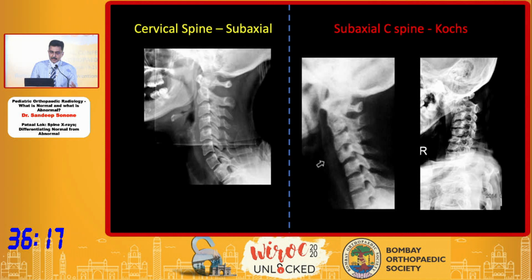This is a classical example of how we can pick up if we have normal anatomical landmarks in our head. The X-ray in the middle shows that there is loss of disc space between C3 and C4, indicative of intradiscal destructive pathology, which may possibly be TB. We have to prove it by biopsy diagnosis.